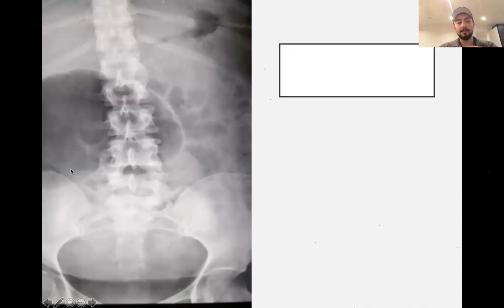And the cecal volvulus has what they call a baby sign, because it kind of looks like a baby inside in here. So again, you can use these signs to help you spot these diagnoses. If you look at everything else, you can't really see the bowels here clearly. Maybe this looks like the descending colon or the transverse colon. Actually, this is the descending colon. So it's not very clear in this picture, but you can see that sign in here.